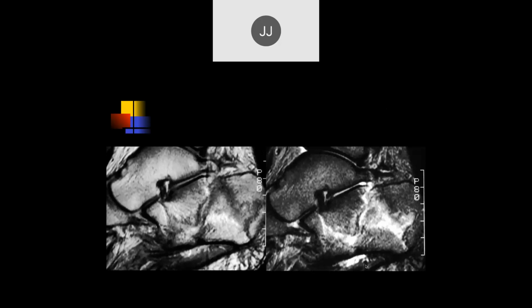Yeah, this looks like a comminuted fracture of the calcaneus. And you can see this is a different character to it. This is actually somebody who was on a table. The table collapsed and they came straight down on their calcaneus to the ground. And this is a kind of a pylon fracture of the calcaneus.